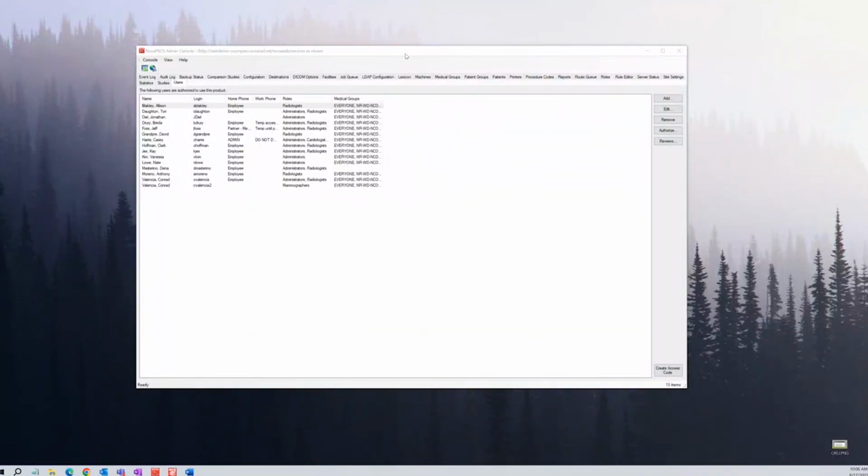All right. PACS Admin Console. I'm sure the majority of us here are very familiar with this. I'm afraid that some of you veterans out there probably know more about this than I do, but we're going to give this a shot. And like Jonathan said in the chat, if you're having a hard time seeing the screen, there's a plus and a minus in the lower left-hand corner for zooming in and out. And if you have any questions, please use the Q&A option in the Teams window.